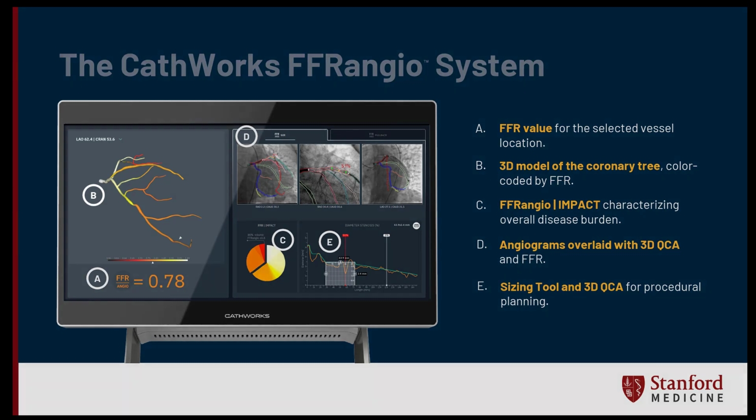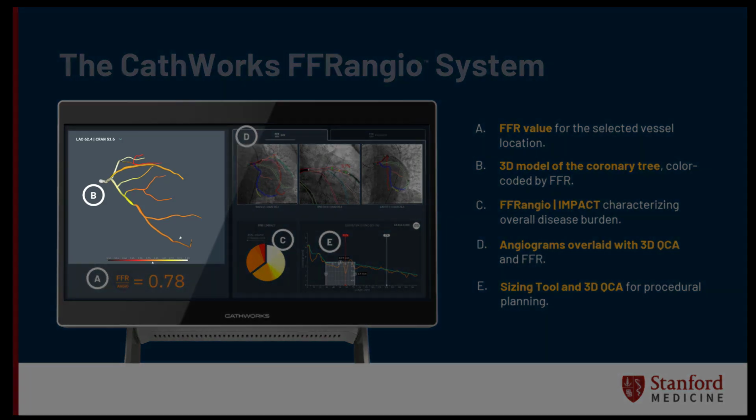The second is you get the 3D model of the coronary tree, which is color-coded by FFR, which very quickly to the eye draws you to the area of the lesion or the segment, particularly if it's a long diffuse lesion, that is of interest and may need to be treated. It also will give you an idea if there are multiple lesions in parallel or in series or in side branches and other aspects of the coronary tree which may also need to be treated.